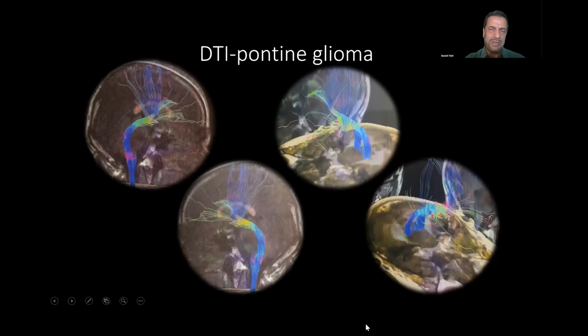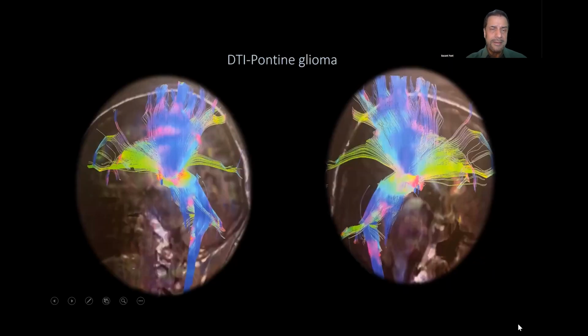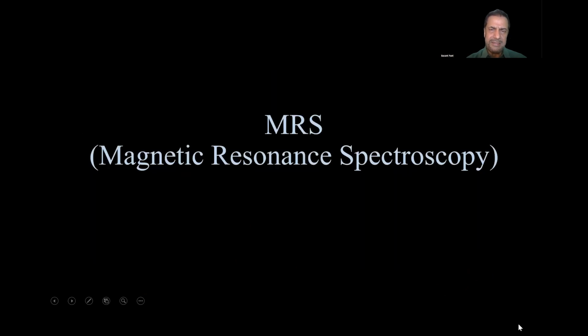While doing surgery, I also put my cursor in each of these axes and see if there are any corticospinal fibers there or not, and then actually trace out from where I can go in. Similar case. And another possibility with the MRI is MR spectroscopy.